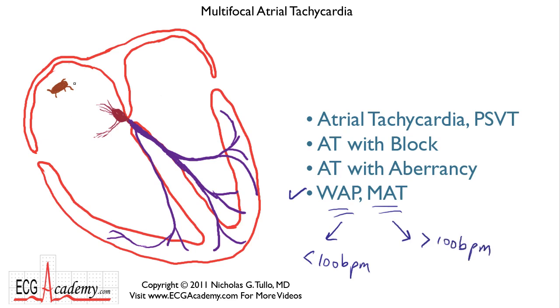Well, remember the normal sinus rhythm comes from the sinus node, and you should have electrical signals originating from the sinus node and spreading rapidly across the atria. Of course, this brings the atrial vector down into the patient's left, and you should see positive P waves in lead 1 and also lead aVF. You know that atrial premature beats arise from somewhere else in the atrium, and because the electrical signal is going in a different direction, the P wave will look different.